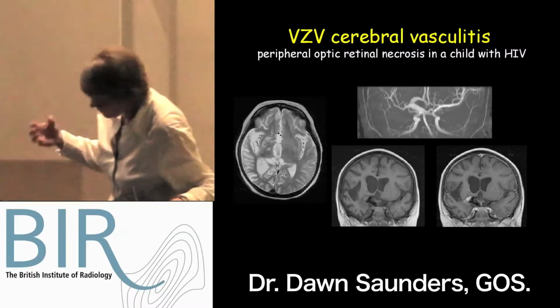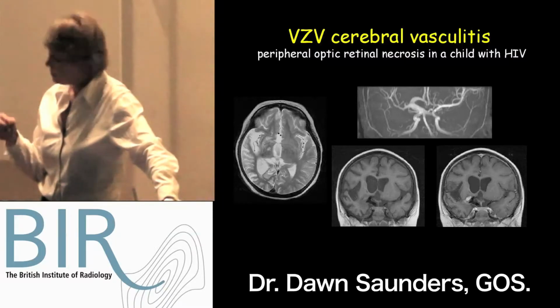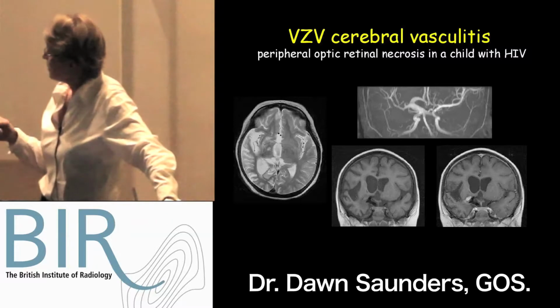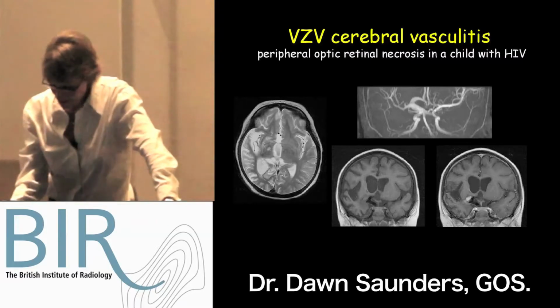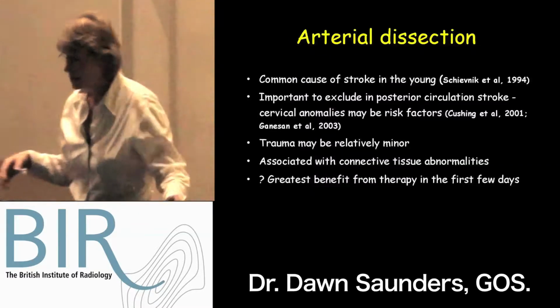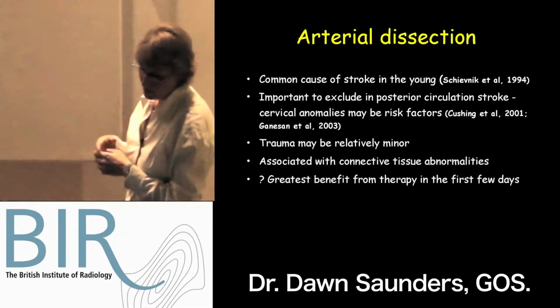It doesn't demonstrate very well, but there's a lot of interest at the moment about the diagnosis of vasculitis in children using enhancement of the vascular wall, because, as I'll show you, the diagnosis of vasculitis is quite a difficult diagnosis in children to make.